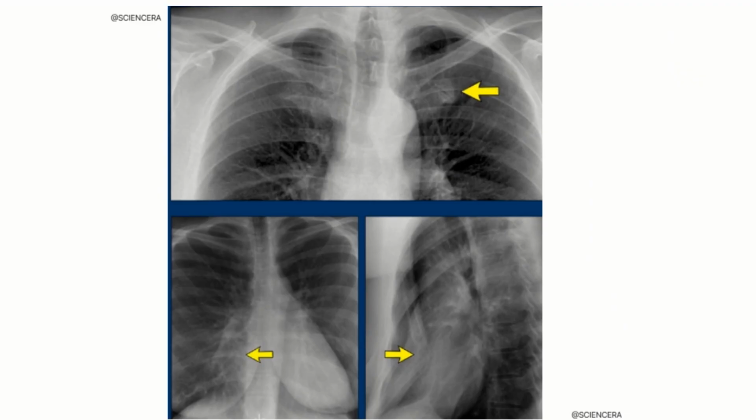There is another X-ray film here. Let's look at the upper structure. Sometimes in an X-ray, doctors see what looks like an extra joint at the front of the first rib, where the bone connects to the cartilage, the softer, bendy bit. They are pointing it out with an arrow. You can see it in the yellow here. This might seem like a problem because it looks unusual, but it's not actually a problem. It's just a normal variation that some people might have.